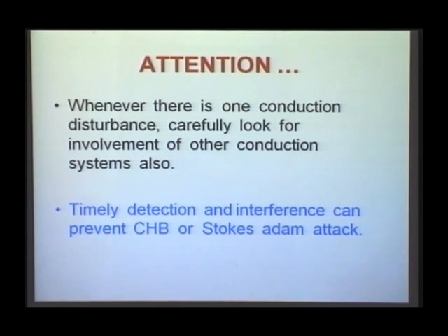Obvious is obvious. Look for the inobvious. Everybody will look and diagnose a right bundle branch block. You should not be happy about diagnosing right bundle branch block. You must keep on seeing what other things are there. In ECG reading, the secret is to try to see and diagnose what others will miss. You should not diagnose only what others will diagnose. You must keep on seeing in this ECG what everybody will miss. You must start diagnosing that. Then only you become an expert.